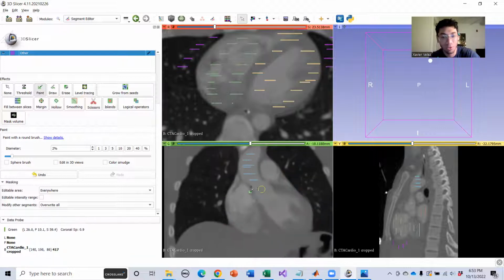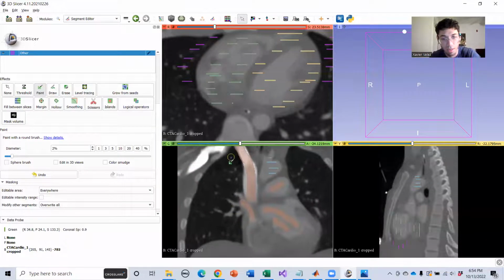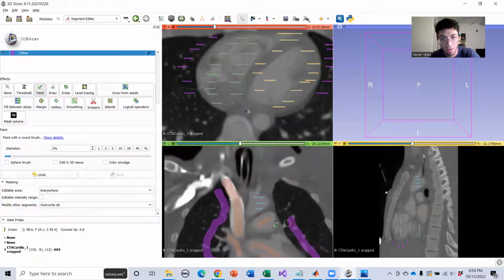Okay. Boom. All right, and we're just gonna move forward, do a few more of these. This bottom part, because I'm skipping it a lot, it might have some difficulty there, but ultimately, it should get the idea that everything outside of these boundaries is no good.